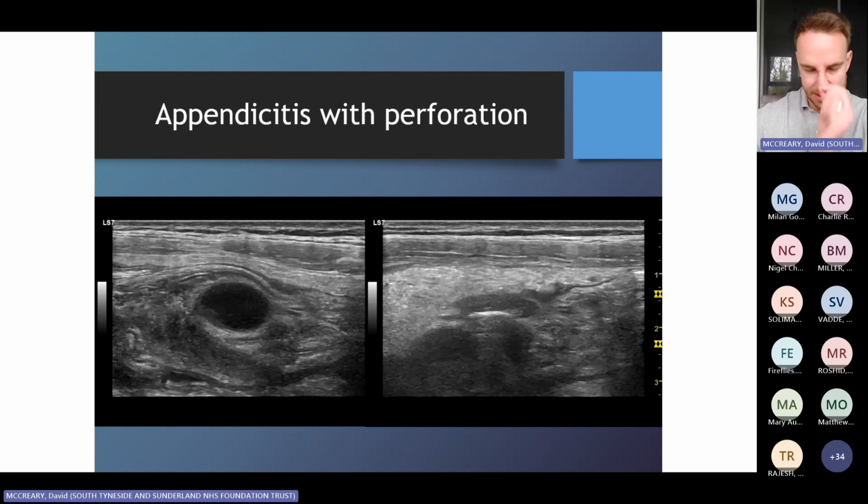The image where I was showing you the small bowel and the large bowel, that was taken on me. I did that on myself last week. And you can see how it's very nondescript. The bowel loops are just peristalsing away. There's no bright, interspersed almost septations within. There's no bright mesentery. It just looks like you're scanning loops of bowel going about their business. Whereas this, all very abnormal, all very abnormal. I wouldn't let this child go home.